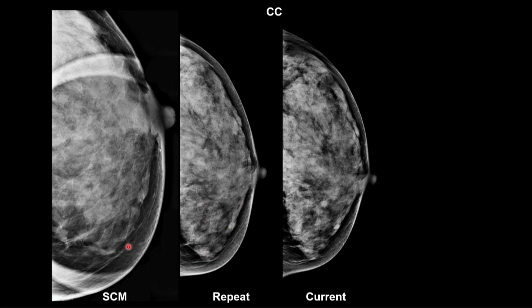What about on the spot mag? The spot mag is taken with the X-ray beam. The positioning may be the same, but the X-ray beam is more divergent because it's a spot mag. And things are not going to overlap quite the same way, which is another advantage of having the spot mag. And also the advantage is you have a fine detail image if you do see it, so you have a better chance to characterize it. Again, here, our finding has got to be somewhere in this area. We know it's within the spot, and we don't see it.